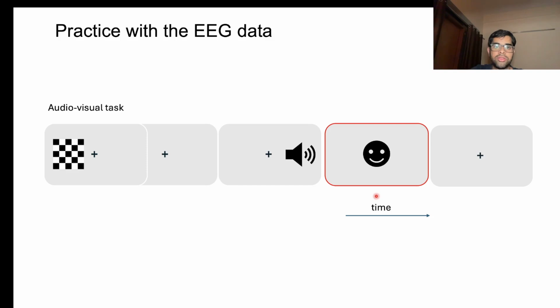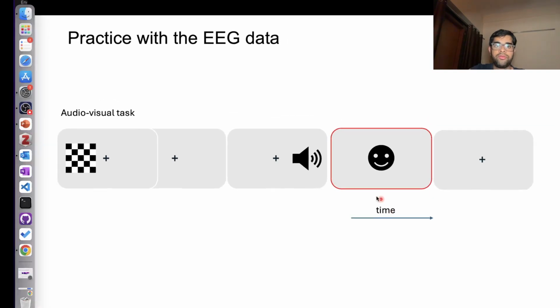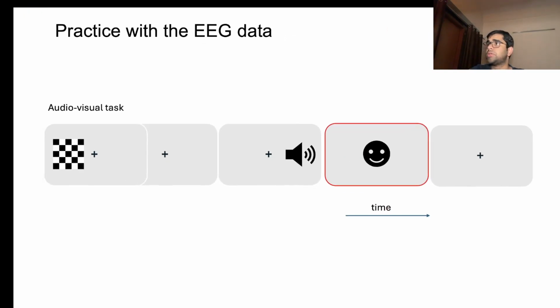Okay, so now we will get into the practice with the notebook. I hope most of you have at least downloaded the notebook. I will go through it hands on. If you have it open on your systems, you can also go through along with me. If you don't have it open, it's okay. You can do it after the class also.